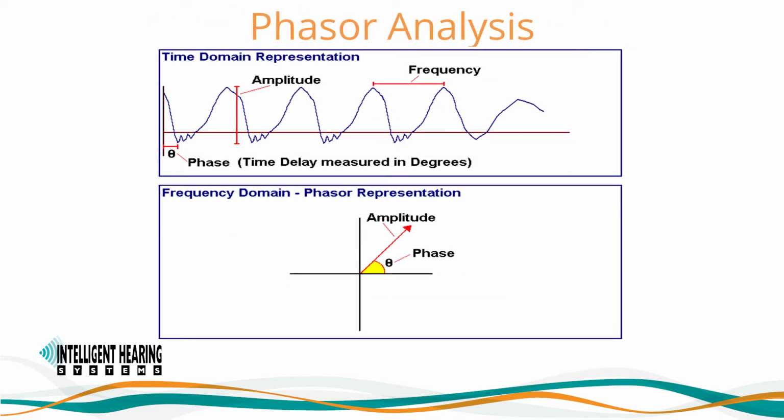The analysis screen will also provide phasor information via the phasor polar plot. A vector or phasor on a phasor diagram represents the amplitude and phase of the recorded response, where the phase represents a measure of time displacement. In other words, the time from the onset of the stimulus to the occurrence of the response is the phase of the response. Unlike an amplitude spectral display, which shows amplitude information across all frequencies, the phasor vector only represents the discrete frequency of the plotted phasor. If multiple phasors are plotted, each one represents the measured response at different, specific carrier frequencies.